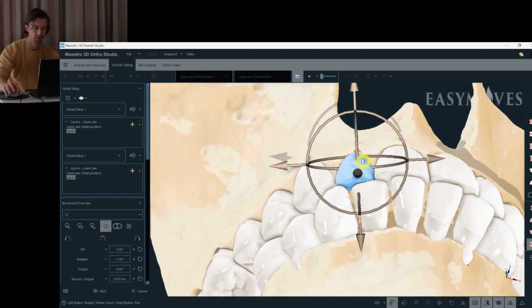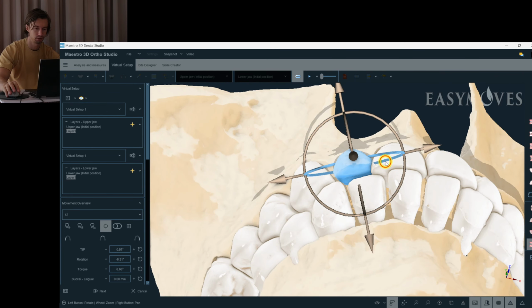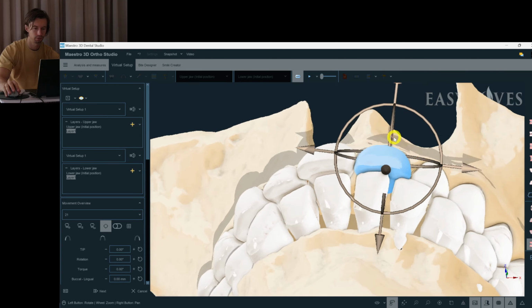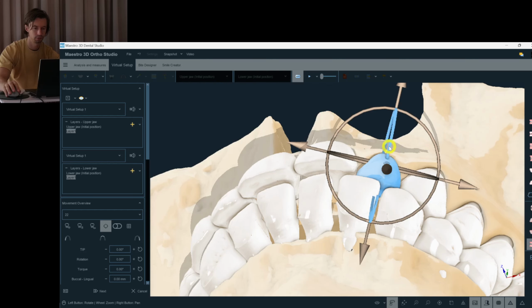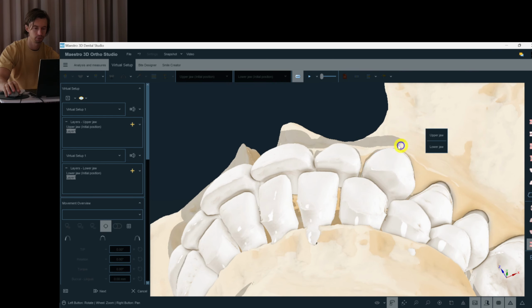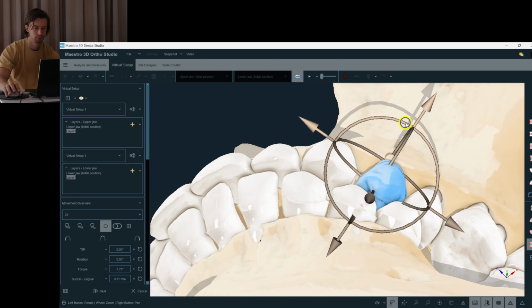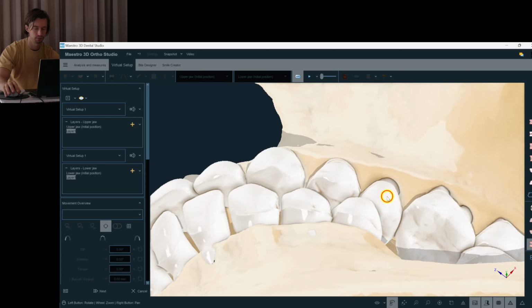In the frontal area, we have to make some sagittal gap, so that the teeth on the lower jaw can expand in the way we do it on the virtual setup, so that they can expand in real life. So we need to maintain some sagittal gap at the time of the expansion.